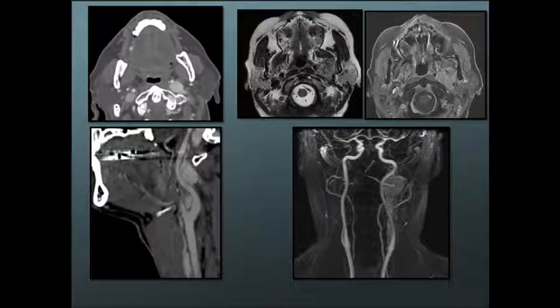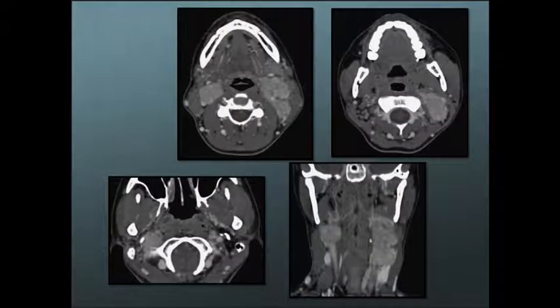This was a 63-year-old male who was getting an MRI for hearing loss, and this lesion was incidentally detected. Upon further investigation and assessment for this mass, he was found to actually have another one at the carotid bifurcation. So he not only had a glomus vagale, but also a glomus caroticum. And that's an important take-home message. Whenever you see a lesion that looks like a glomus tumor, start looking for additional ones, because you will frequently see additional ones in the neck.